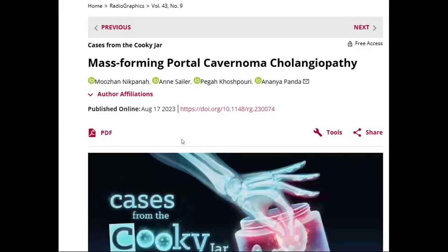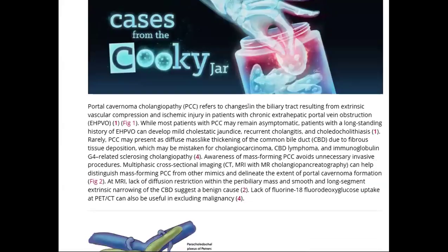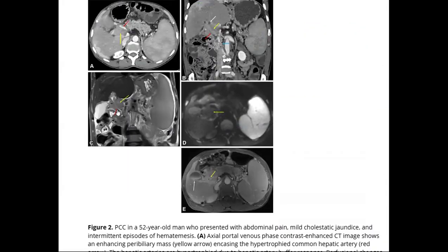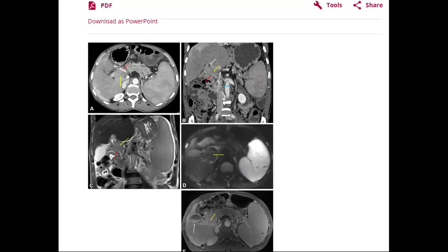There's a rare variant in which portal vein thrombosis and the cavernoma cause so much fibrous tissue. That's called mass forming portal cholangiopathy, not commonly seen. On imaging it looks really, really dark on T2, but I think there won't be as much diffusion restriction. So I think I was wrong on that. I think Victoria showed a case just like this. But yeah, that's an awesome case.